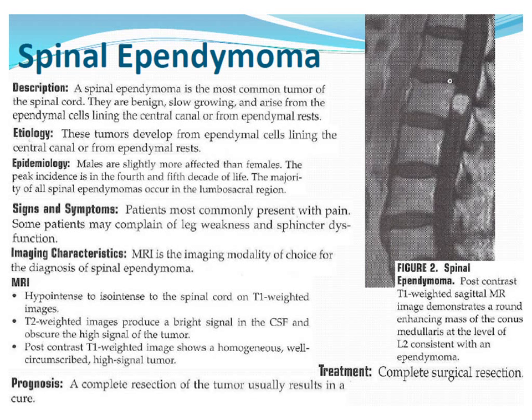And so it'd be important, if you saw something that's rounded like this in the canal like that, to make sure that we're doing some post-contrast imaging, as long as the patient's allowed to have contrast. And if not, just check with the radiologist and make sure that they won't want to do contrast. Same thing goes for any other kind of spinal tumors, like metastases would be a common one.